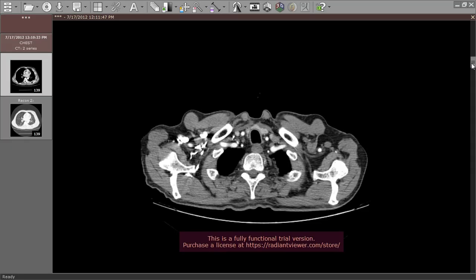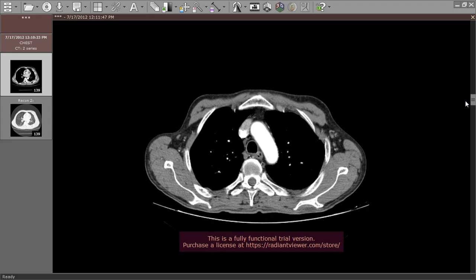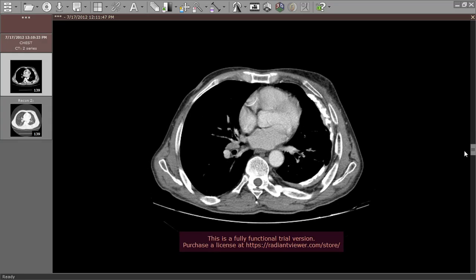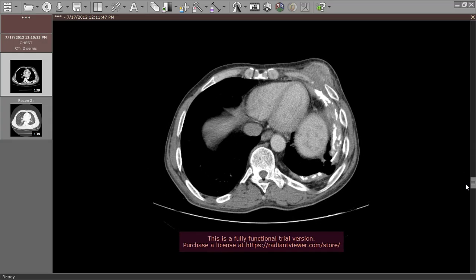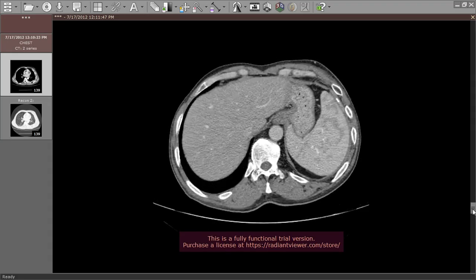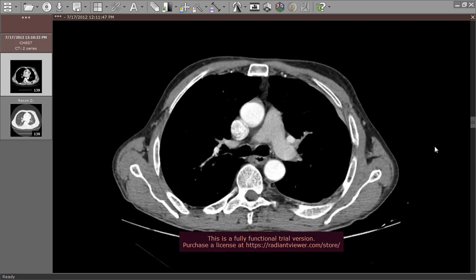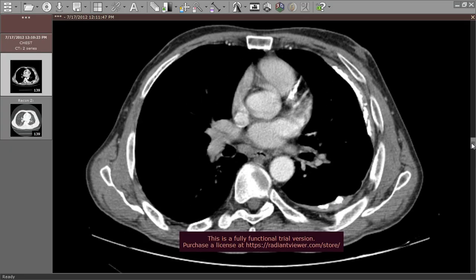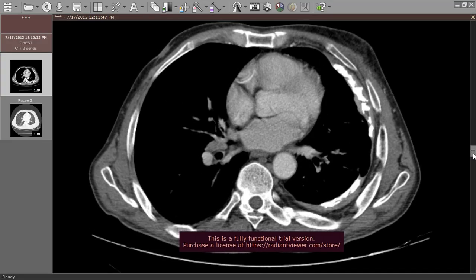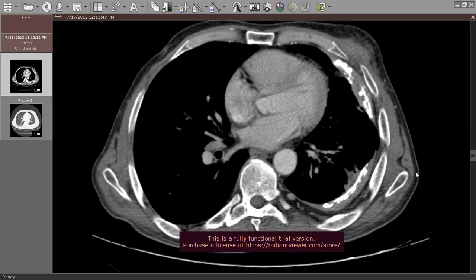Case number 5, a man presented with a chest wall mass lesion. You can see this pleural soft tissue thickening with calcific changes, dystrophic calcific changes, heterogeneous calcific changes with soft tissue thickening, irregular soft tissue thickening.